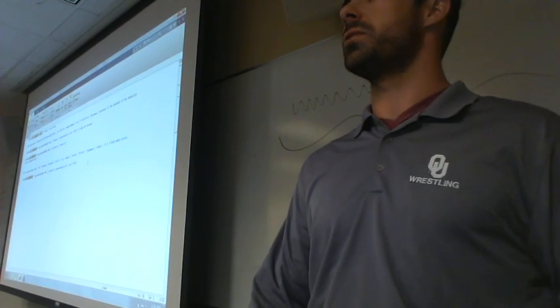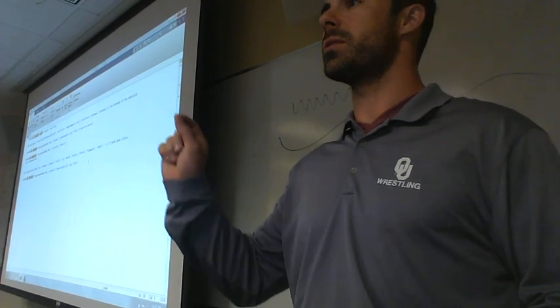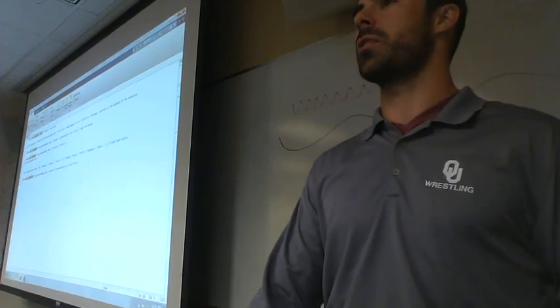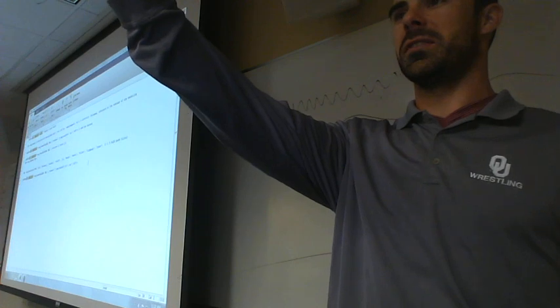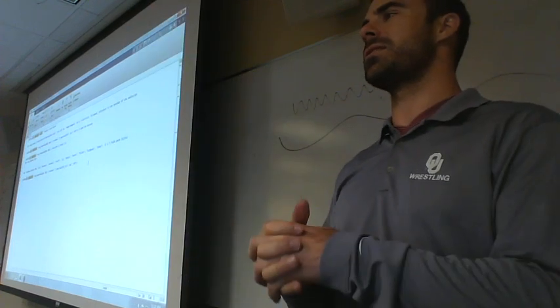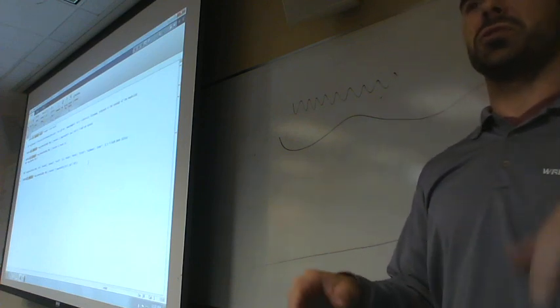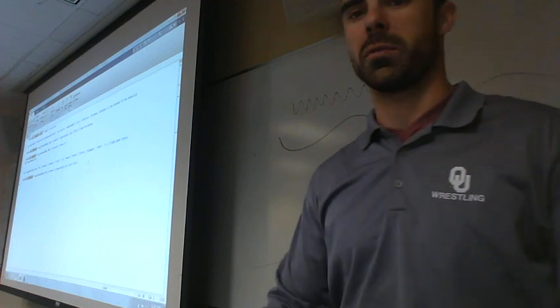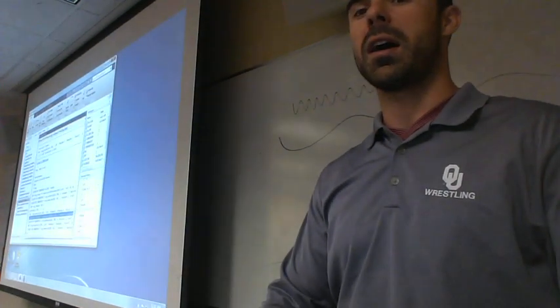So this is a way to take digital notes, if you don't want to take them by hand, of what we did. Let's say my computer crashes, or he says, I forget your name? Arturo. Arturo goes, oh man, I lost this and this, how do I do this? You can just literally rerun this script and it'll take you back to exactly where you were. So it's good to keep records of what you do. Let's go back to what we have.